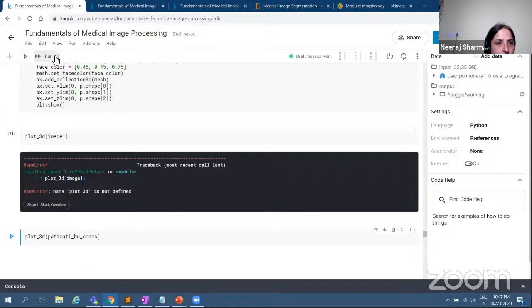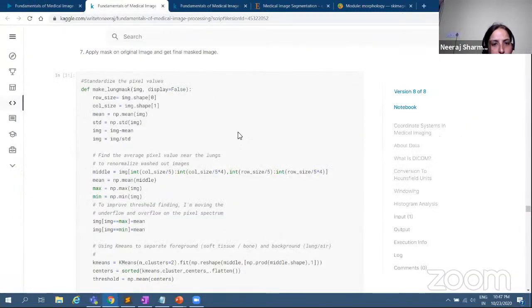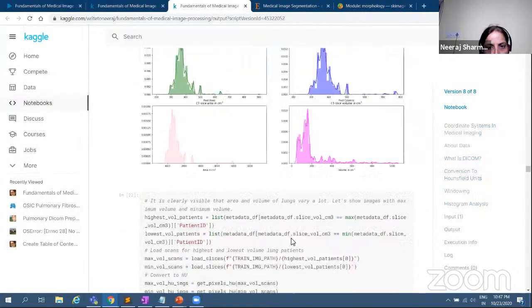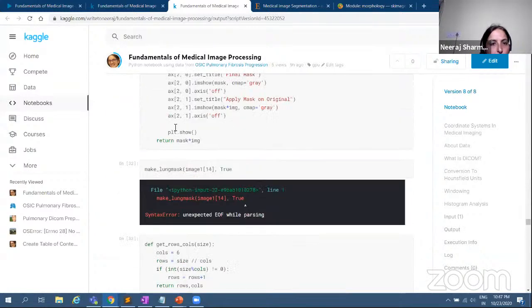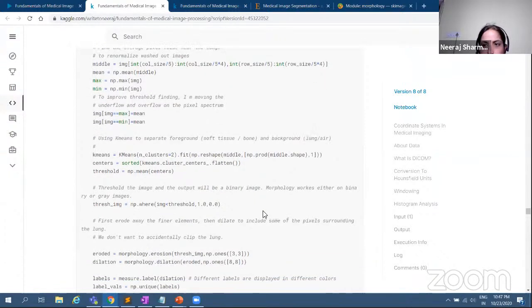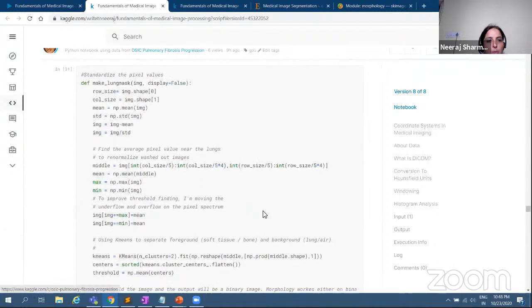Okay, let's run it whole. Maybe by the time I finish the segmentation explanation, that should work. I know that is a problem. I'm sorry for this. I will check later if time permits, and see if I can show you the older version.